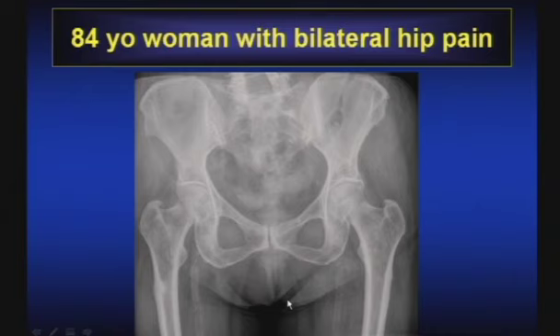So I'm really going to be testing your knowledge here, your eye, I guess, in the first place. So, if you look at things initially, especially as a musculoskeletal radiologist, and don't see something that jumps out to you. When we're first starting to read bone plain films, we have our residents and fellows follow margins of cortices, and they should be absolutely smooth. And if they're not, we have to consider why. So we follow our cortical margins around the femur, and we've got a bump here. So if we've got a bump, the first thing we ask ourselves is, is there a soft tissue attachment site there?